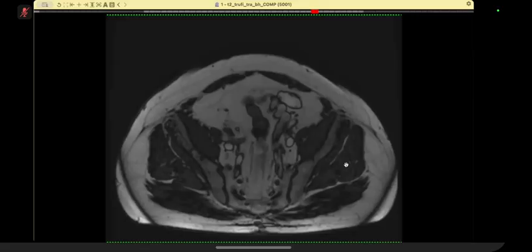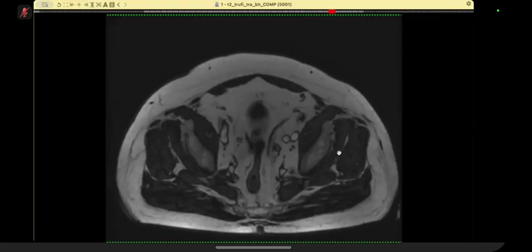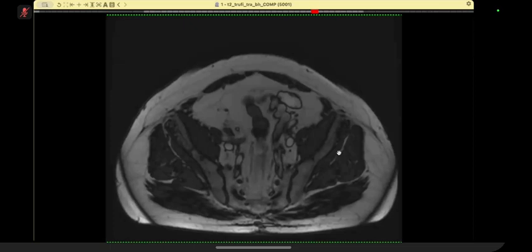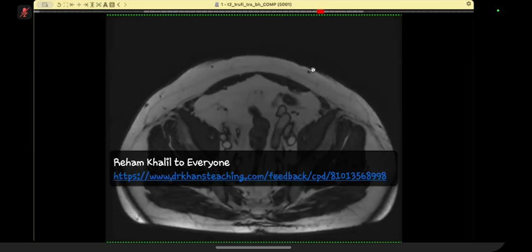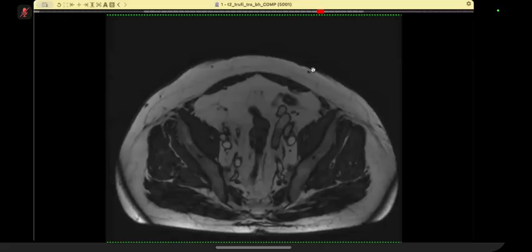To take things further, we can do a urine routine to rule out any infections and to look for any RBCs. We can also advise cystoscopy with ureteroscopy. Pathology-wise, I think this could be a transitional cell carcinoma of the distal ureter. Okay, thank you.